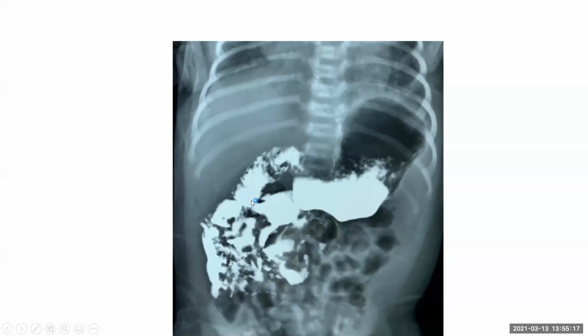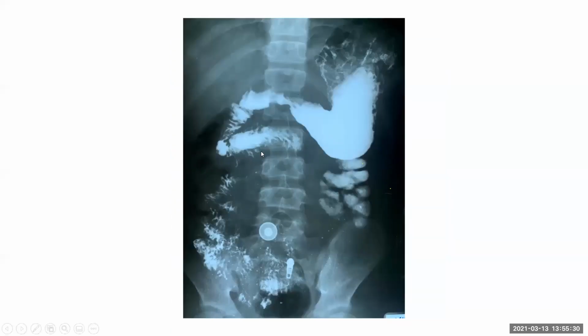This is a barium follow-through study, and this is malrotation. We can't see the duodenum going towards the left of the spine, right? And this is another malrotation, the duodenum third part here, and this is with volvulus. It didn't go to the left of the spine, and it should be at the level of the duodenal bulb, right? And this is with the corkscrew appearance.